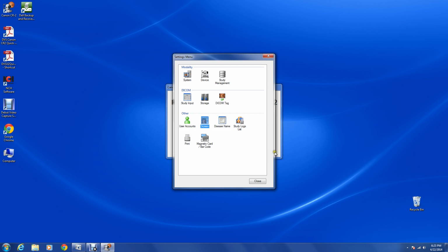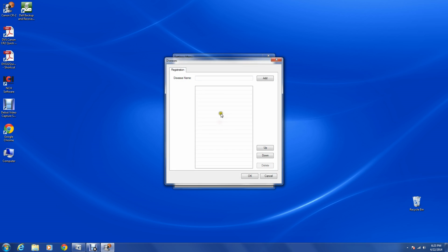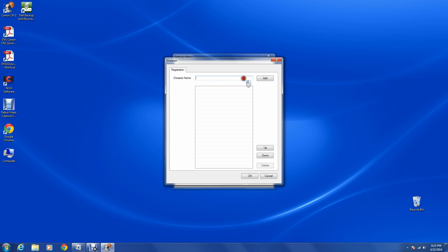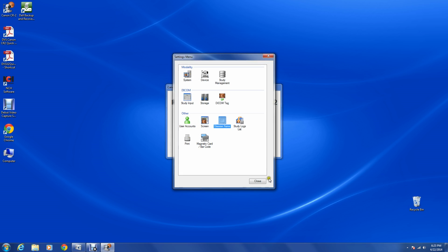Show you that. And disease names, you can have all these different names for your diseases. You add them in as you go. There's nothing been added into this one, so you can do that. You have to click it in here, name it, then add it in. This is a new system, so we won't do that.